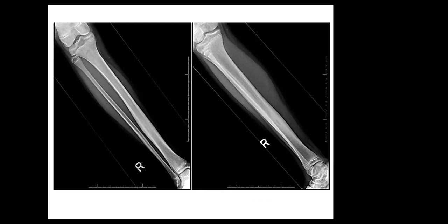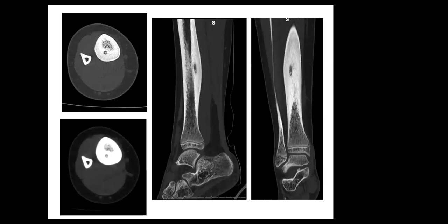You could say there is soft tissue swelling, but edema cannot be seen. If you saw soft tissue swelling, it could be because of edema, tumor, or inflammation, but we don't really see the edema on the radiographs anyway. Then we move on to the CT, and I think also we need to get the terminology right, because you were saying signal intensity all the time. And signal intensity is MRI terminology, not CT terminology. You said bone marrow edema, and again, that is something we see on MRI, not on CT.